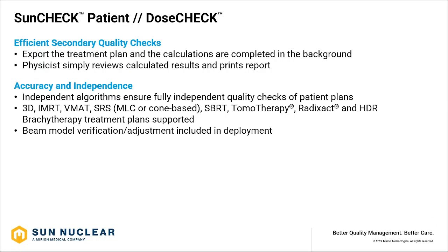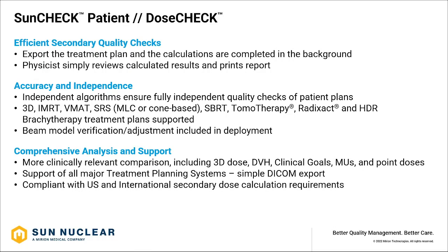So within DoseCHECK, which we will have a look at shortly, you have the option to not only look at beam MUs and point dose calculations, but you are presented with more meaningful dose information, which includes 3D dose, complete 3D dose recalculation on the patient CT. You can have a look at the plan's DVH, the clinical goals as well that have been set by the doctor, as well as the MUs and point doses that have been calculated.